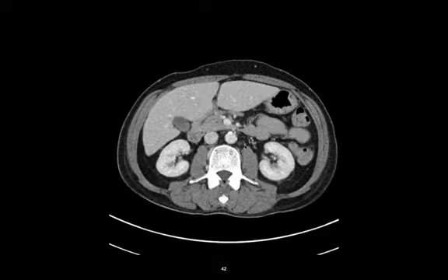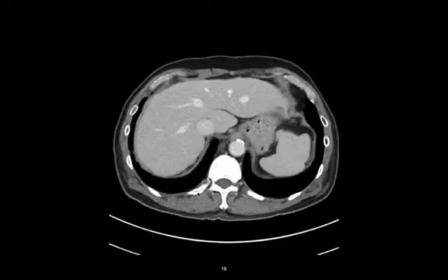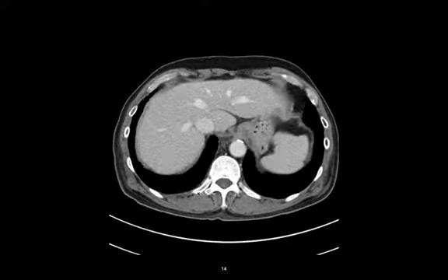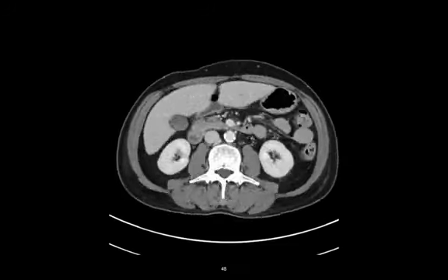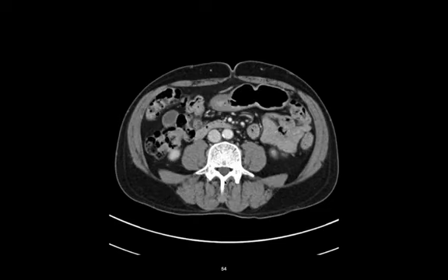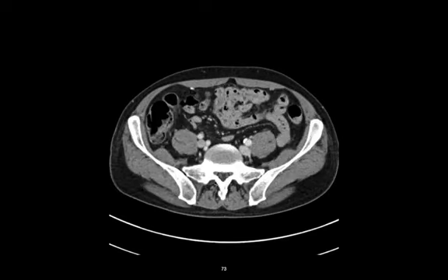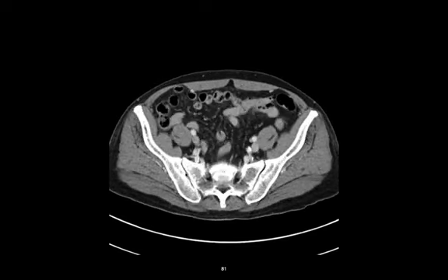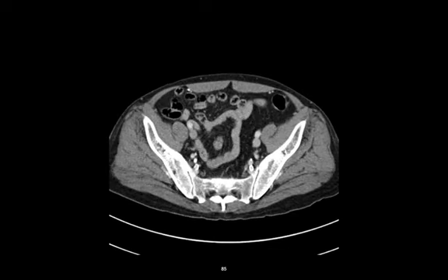Now let's talk about the different vertebrae that we're going to see. You follow the ribs back. We know that's a thoracic vertebra because it's articulating with the rib. We come down and the ribs disappear, so you're like, oh, these are lumbar vertebrae. How else do you know they're lumbar vertebrae? You've got these big mammillary processes and they're segmented. Then we go all the way down, we see the ilium, and we have this bone right here. That's the sacrum, and there's the sacroiliac joint right there. It's the SI joint. It's actually a synovial joint; it just doesn't move a ton. So there's the sacrum.